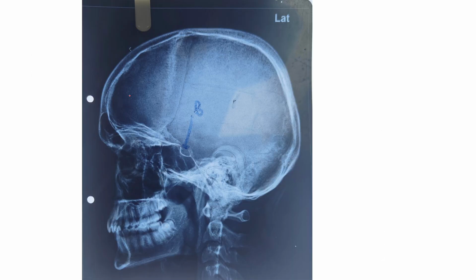Now in this X-ray you have to identify outer table, inner table, diploe, coronal suture, anterior division of middle meningeal artery, and frontal air sinus, orbital plate of frontal bone, anterior clinoid process, posterior clinoid process, and hypophyseal fossa, the clivus, the petrous part of temporal bone, the mastoid air cells, the internal and external acoustic meatuses, the auricle.